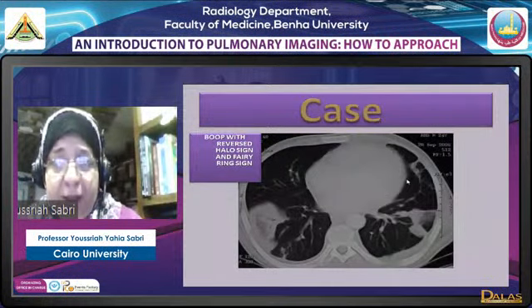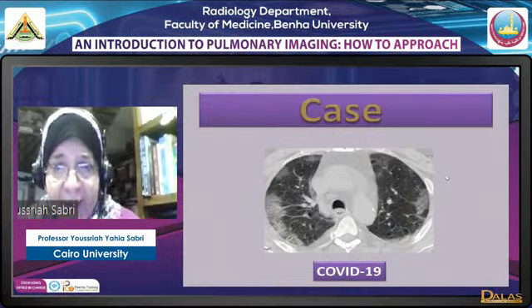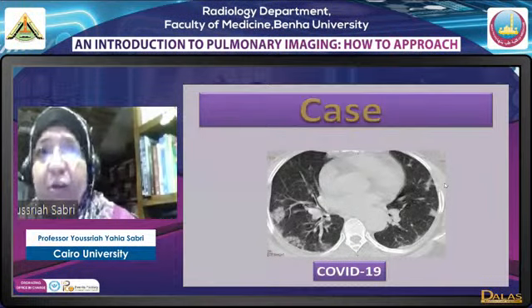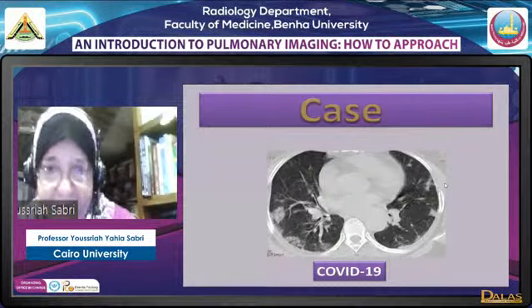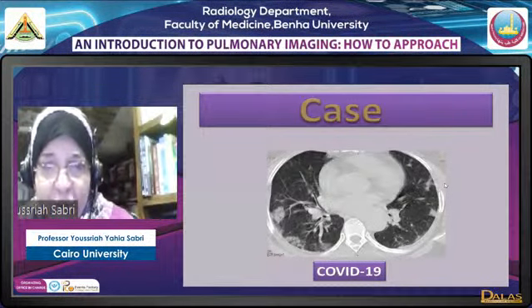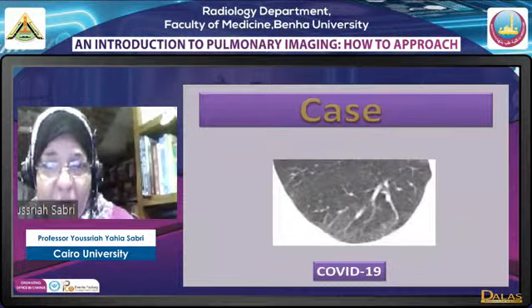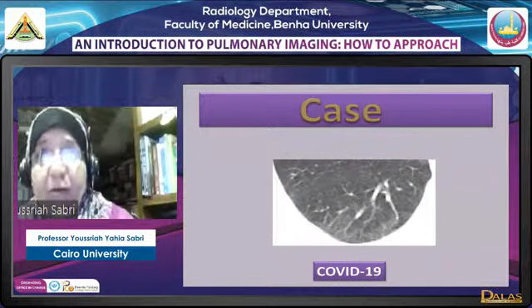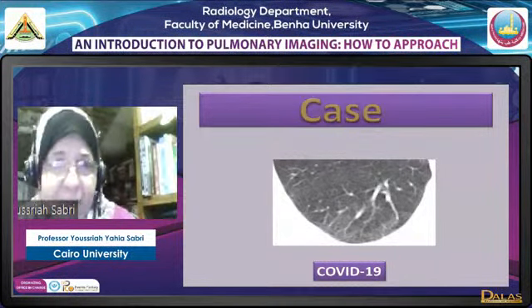Organizing pneumonia, as you can see, sometimes is associated with the reversed halo sign, which is very pathognomonic for organizing pneumonia. This pattern of bilaterality we see a lot today in COVID-19 because, as I told you before, COVID-19 may present with a pattern of atypical infection or a pattern of organizing pneumonia. So this pattern is due to organizing pneumonia. These are all cases of COVID-19. They could be bilateral, and we see a lot of unilateral cases, actually, mild unilateral cases, as in this case.